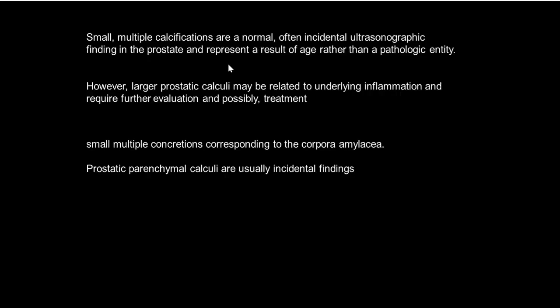Often an incidental ultrasonographic finding in the prostate represents a result of age rather than prostatic pathology. However, large prostatic calculi may be related to underlying inflammation and require further evaluation, possibly treatment. Small multiple concretions corresponding to corpora amylacea, prostatic parenchymal calculi, are usually an incidental finding.